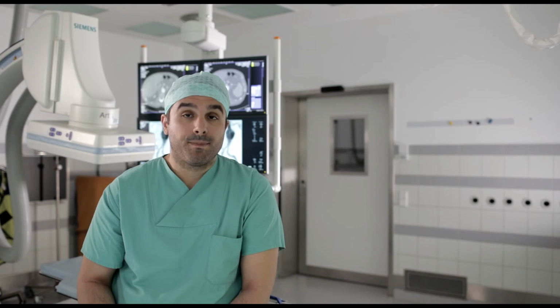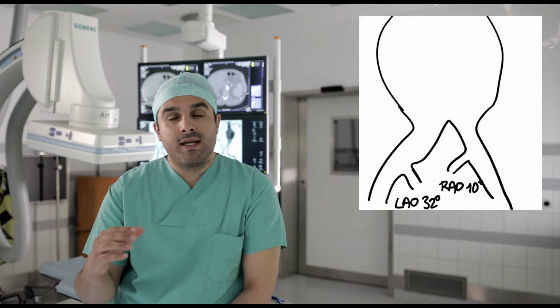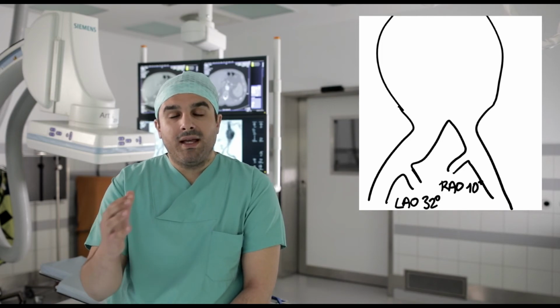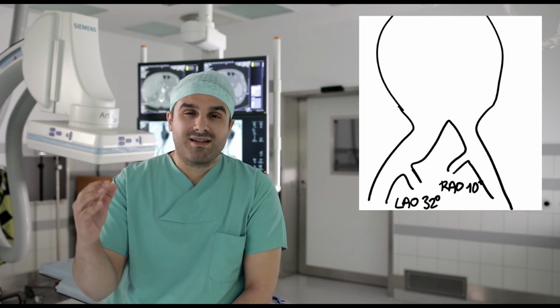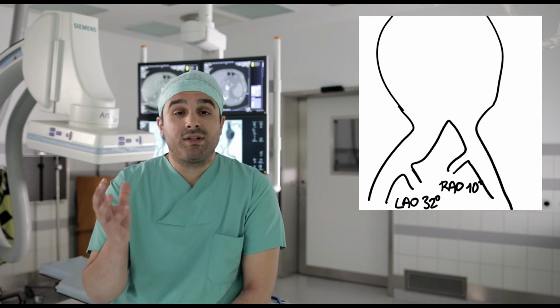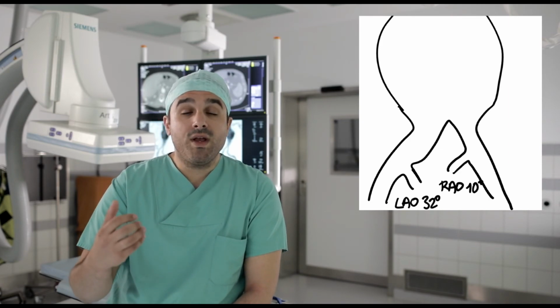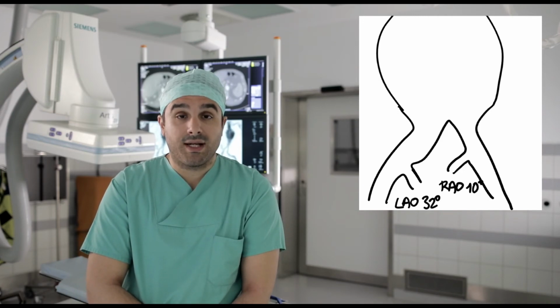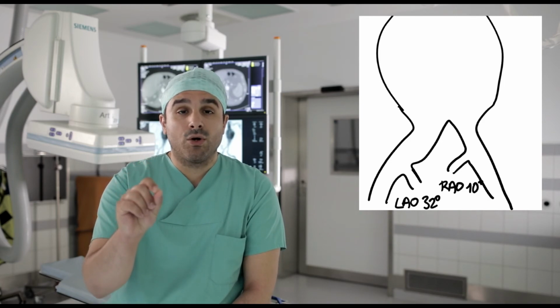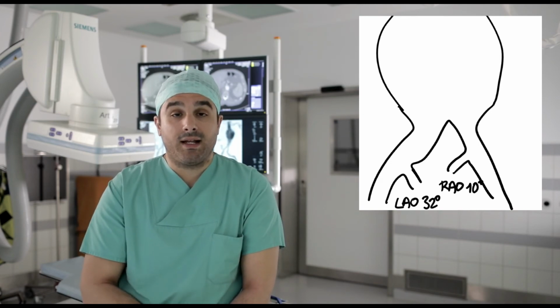In cases that you have to go up to the hypogastric arteries, sometimes it may be difficult to rotate the C-arm in such view in order to see exactly the origin of the hypogastric artery. But in your CT scan, you can rotate the aneurysm in the 3D reconstructions in different views to see which one is the best for the origin of the hypogastric arteries. In that case, just inform yourself by drawing the exact LAO or RAO position in order to use it directly during your intervention.